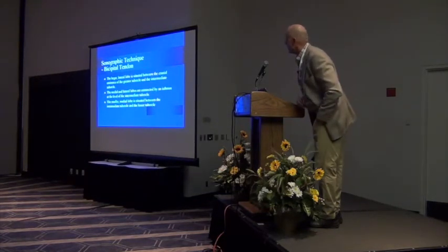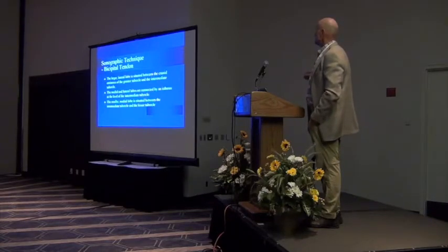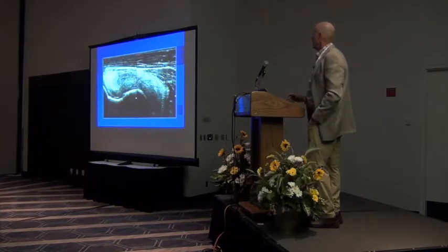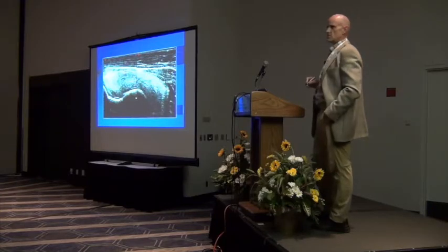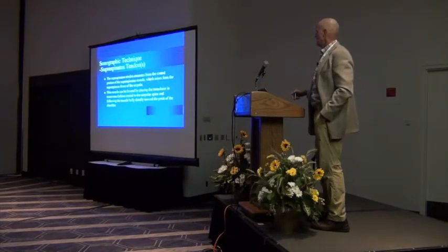So the lateral lobes, obviously, are right juxtaposed to the cranial eminence, the greater tubercle, and then obviously they go around the intermediate tubercle to join. And this is what we try to do. We try to join the split screen so that we can see the whole structure together. Now, the one thing that I would tell you is I would strongly suggest you look at the contour of the bone at this level, because we see some changes that will develop in there with chronic change in that area.